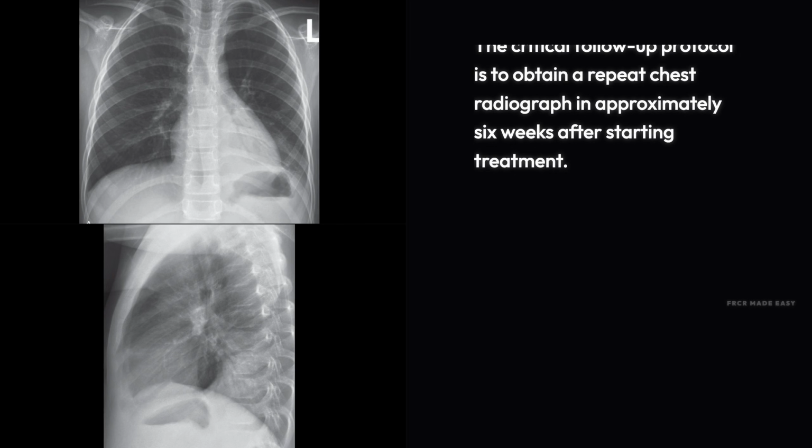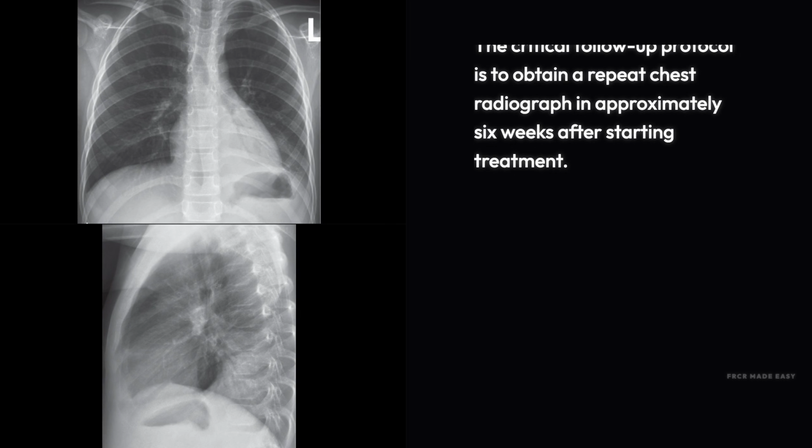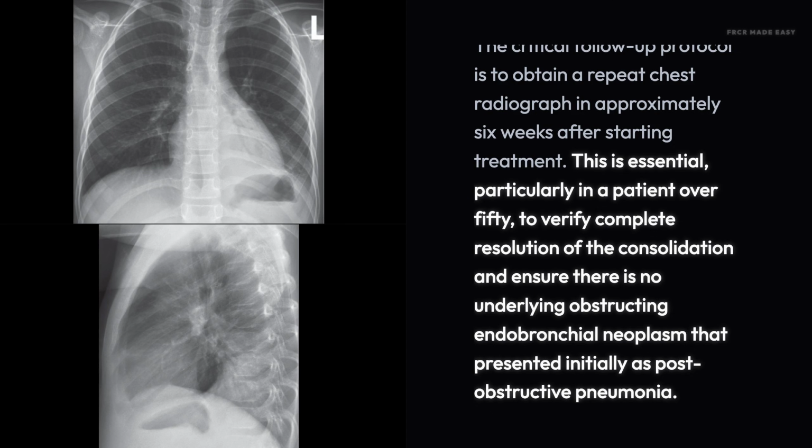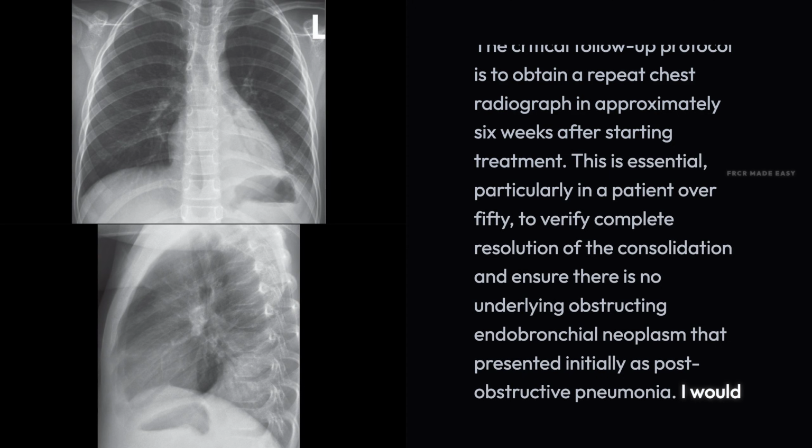This is essential, particularly in a patient over 50, to verify complete resolution of the consolidation and ensure there is no underlying obstructing endobronchial neoplasm that presented initially as post-obstructive pneumonia. I would recommend initiating empirical antibiotics and scheduling the follow-up film.